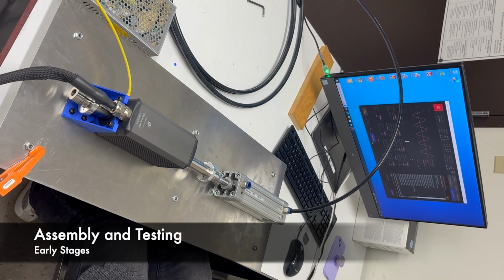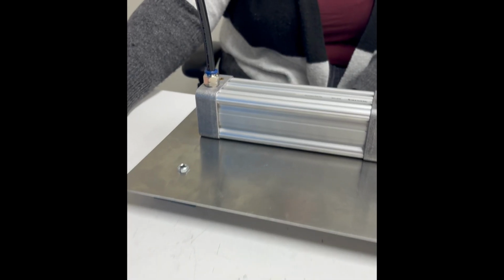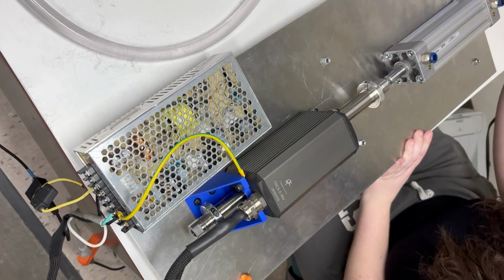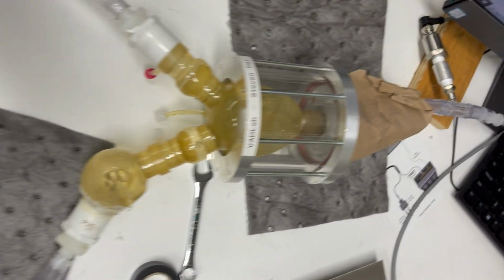Putting our idea into action was certainly a journey. We ran into many different issues, from getting a hold of IT, to base plate movement and misalignment due to oscillations in the sheet metal, to air leakage and fitting issues. After fixing all of those problems, we were able to see our idea in action and finally get results.